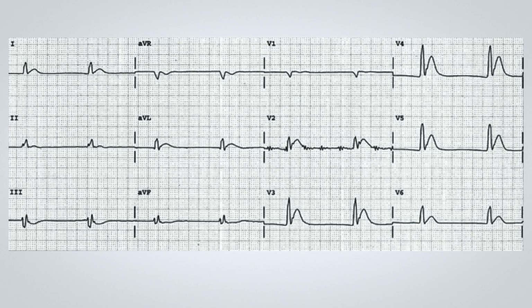Let's examine this ECG from a patient who presented with severe hypercalcemia in the context of diabetic ketoacidosis. In this ECG, we observe a notable absence of the ST segment attributed to accelerated repolarization. Additionally, prominent ST elevations with J-point elevations are also evident. These findings shed light on the complex interplay between hypercalcemia, diabetic ketoacidosis, and their impact on the cardiac electrical activity.